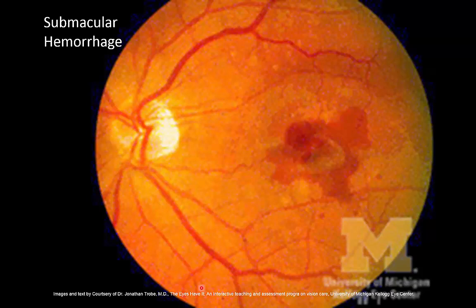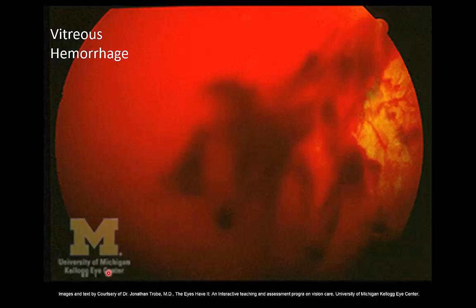And this is what a macular hemorrhage would look like. If this happens, obviously there's going to be dramatic loss of vision because the macula is where we have central vision. And then if we have hemorrhage that goes into the vitreous, we're really unable to see through to the retina at all, and all we see is blood, which is basically obscuring our retina.